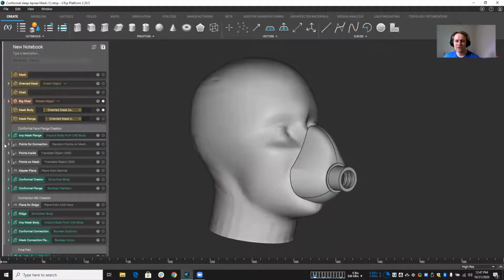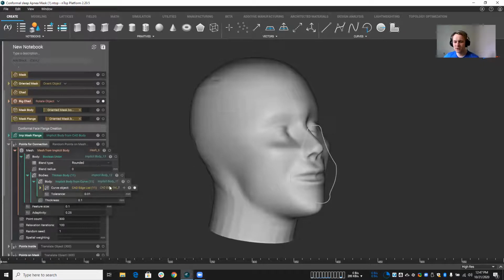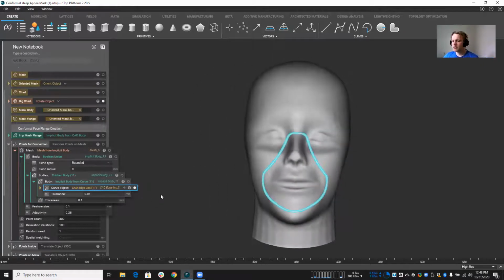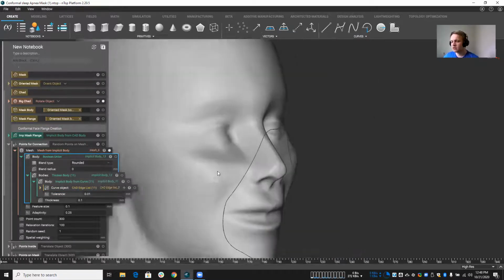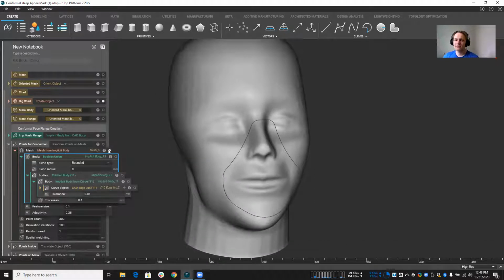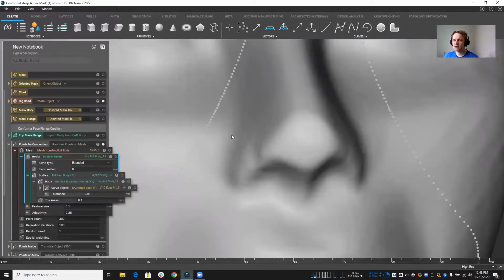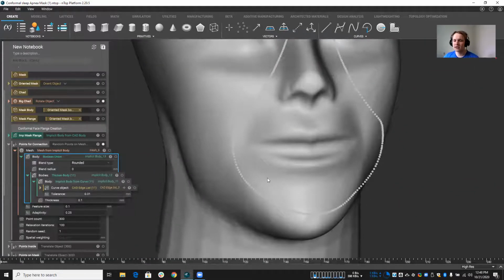Well, what I did was a couple interesting little bits here where I took a CAD edge, you can see here, and this is essentially the profile of the mask connection that we need. So I took this, turned it into an implicit body here with pretty much no thickness. But then I took that and turned it into a little mesh. And you can kind of see that mesh happening. It's not a pretty mesh, but it didn't need to be. And so I took that and I placed random points along this mesh. So now we have this profile laid out in this point orientation.